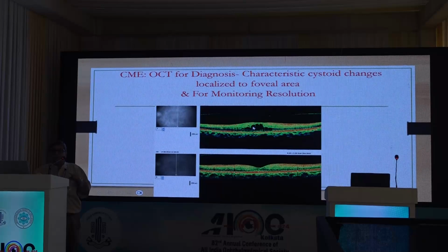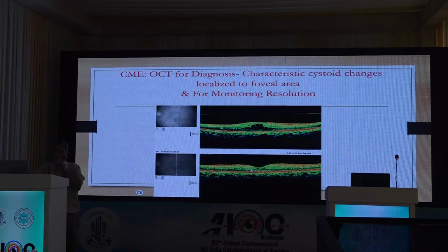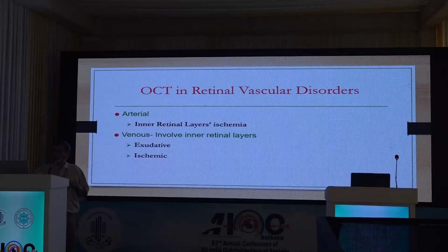You do a cataract surgery. Patient not improving. Just do an OCT. You see there's CME. Treat this patient with NSAIDs and low topical steroids. This is what you will get. Normal. So, for you to ensure good prognosis for your patient, good outcomes, this is an important thing.